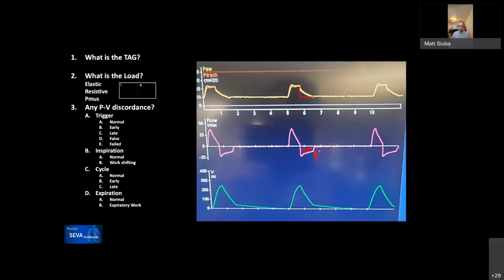Is this a lung transplant patient or something different with their lungs, with differential resistance on two sides? As far as I know, there's nothing particularly interesting about the patient. Because the volume time waveform is also weird. You have a reduction in the tidal volume coming down, and then it's almost like an asymptote, even after the flow has hit baseline. So I wonder if there's a nebulizer or something turned on, or something contributing to the tidal volume persisting after flow has returned to normal in the ventilator circuit inside the ventilator.